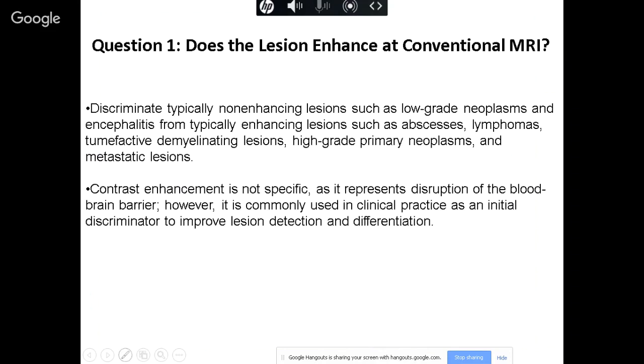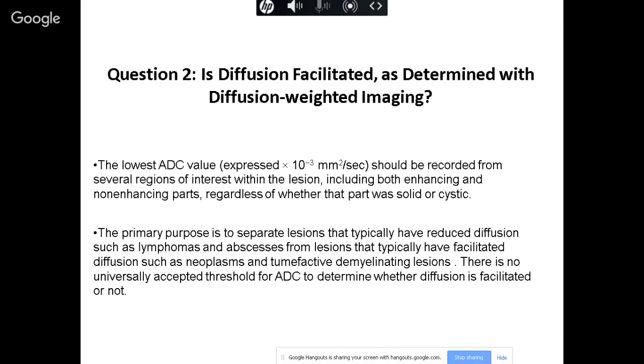Here is how to approach the tumor, I'll email you. Question 1: does the lesion enhance or not? So you always ask this. Why? Because low-grade glioma doesn't enhance, and the others will. Based on the enhancement pattern, you get a differential. Is diffusion restricted or not? On diffusion weighted imaging, always think about the possibility of abscess or epidermoid; these two look very homogeneous. If not, GBM, mets, lymphoma could have restricted diffusion. Low-grade and other tumors don't have this. So that gives you the differential diagnosis.